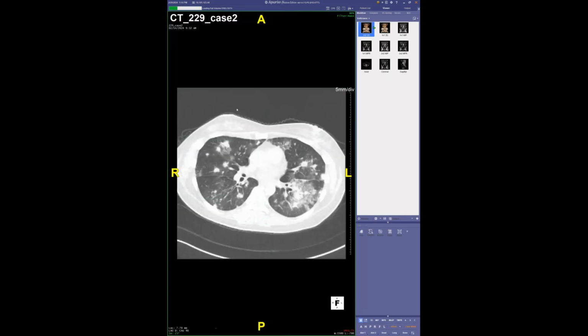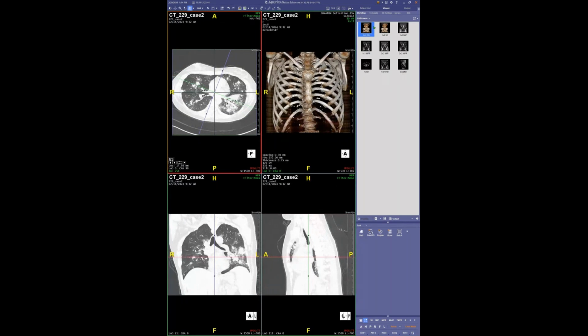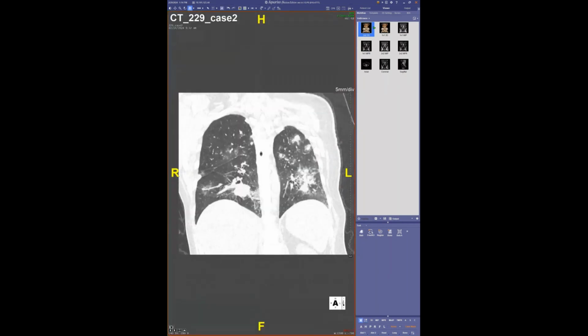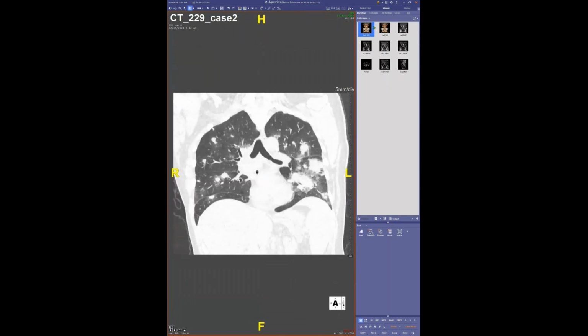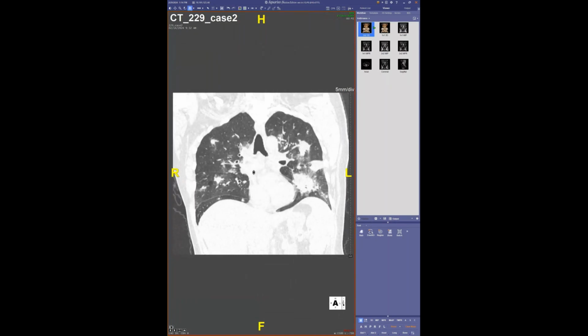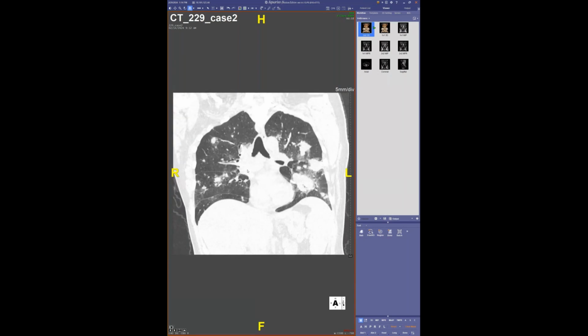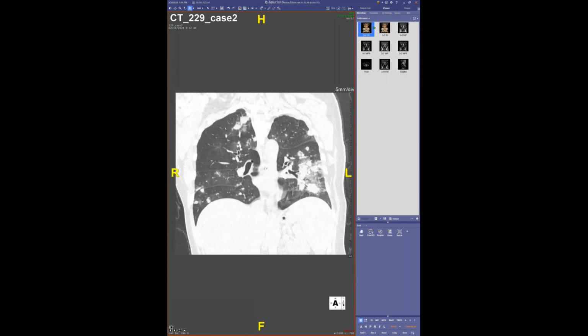So, that was a question, right? Could it be lymphoma? And the weird thing is that I have a chest x-ray intervening where you could see the nodules just completely disappear. I was talking about it with Lynch just a minute ago, and he's like, well, I've seen lymphoma do that too. Low-grade lymphomas melt away with steroids. I don't have the experience with that, but if he says it happens, I'm sure it could.